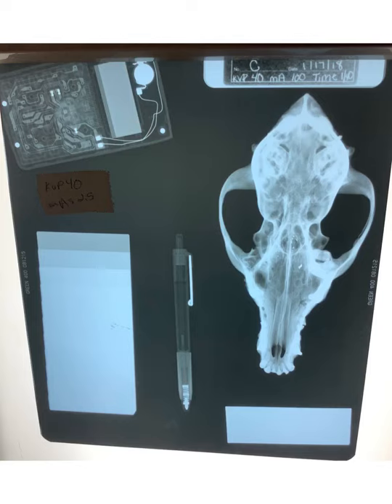So this slide here is the same one we were just looking at. You can see this one has the kVp of 40. So that's what we're looking at on this slide. The two things we're going to focus on are the step wedge, which is right over here, and the skull. So let's start with the step wedge. This is that thick piece of metal, very thick on one side, very thin on the other. So in a stepwise fashion, it goes from thin metal to thick metal.